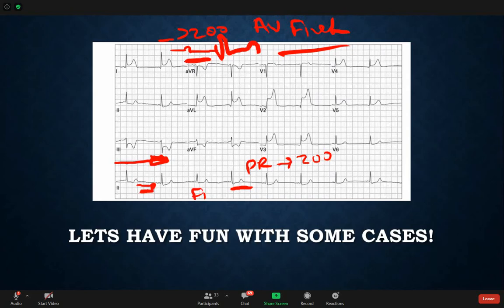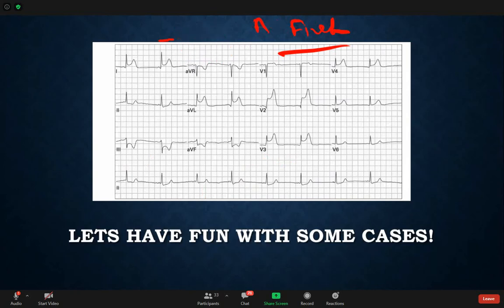First degree AV block is the PR interval. Don't worry about it for now, I'll give you examples. The most important thing for me is that you go systematic, every time, and slowly you're going to get better.